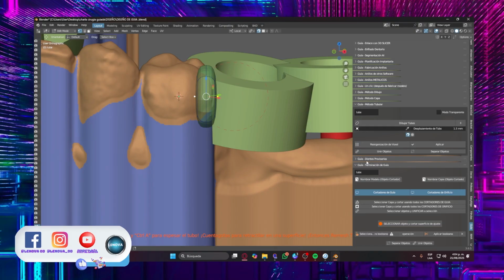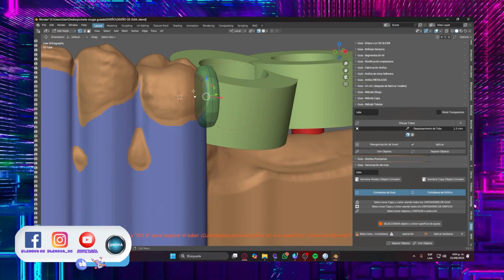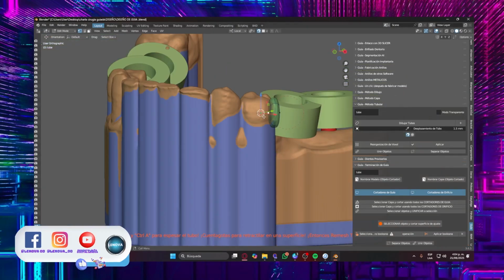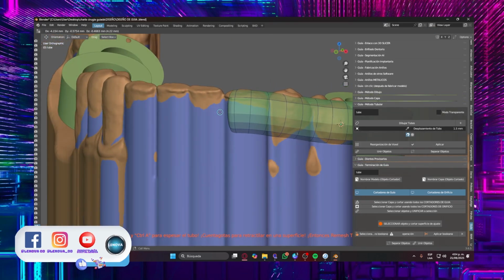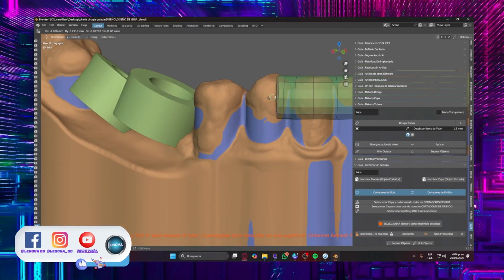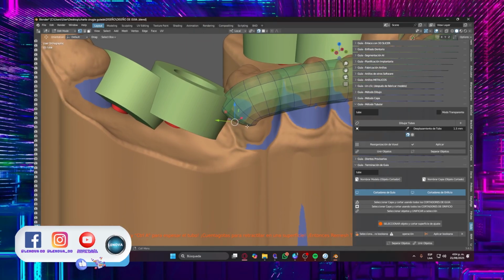Now I return to my guide module. I already know what that thickness is. Beginning. Do you remember just now when we were doing the tracing? Left click, the same command. When I want to make a mesh in the shape of a tube, the command is to press E, extrude, left click, E, left click, and I do this as I like, okay? So, ideally, when you always reach the drum area, touch the drum, important to create a single structure.